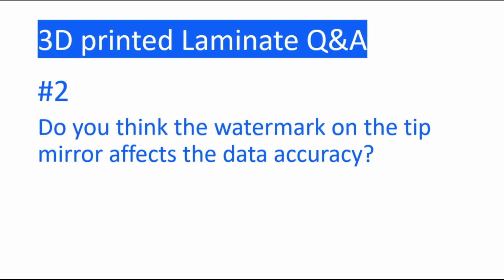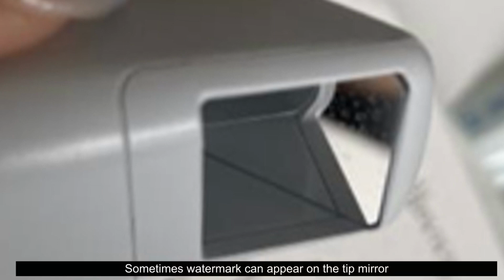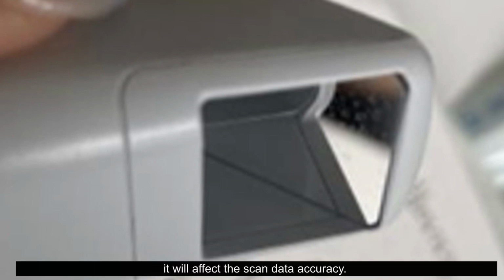Number 2. Do you think the watermark on the tip mirror affects the data accuracy? Medit said that it doesn't affect the scan accuracy. Sometimes a watermark can appear on the tip mirror even if users use the autoclave program recommended by Medit. But as long as the autoclaving is done within the recommended frequency, it should not affect accuracy. In a case when users can recognize the clear watermark through the live view, it will affect the scan data accuracy.